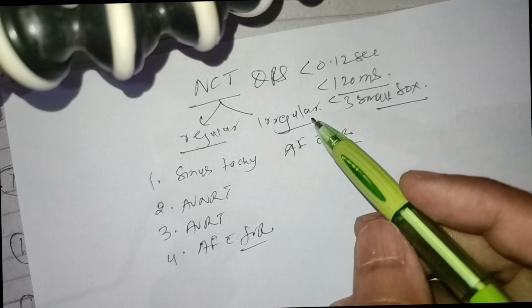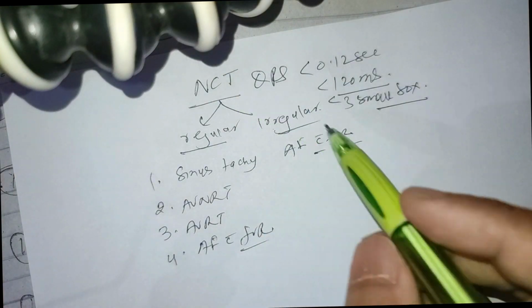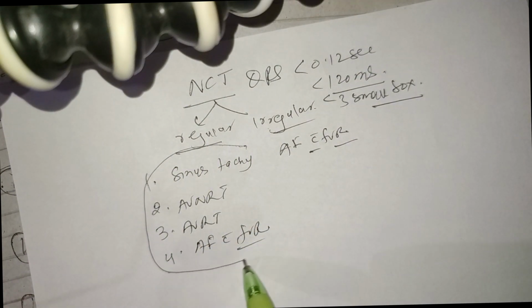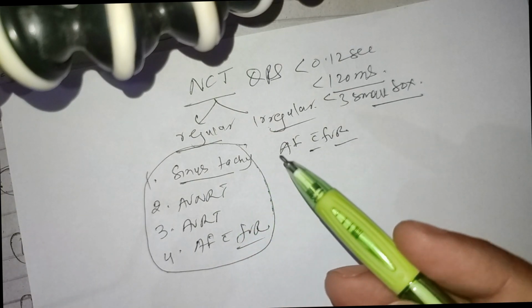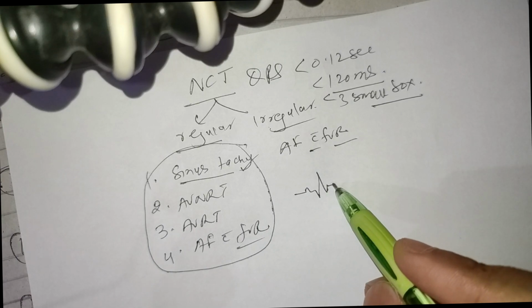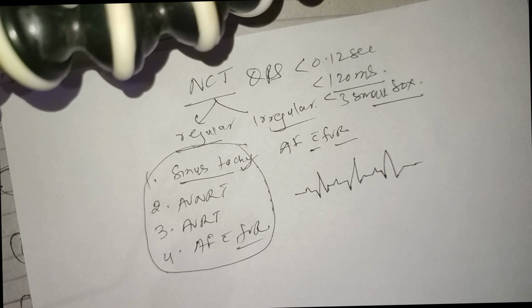So definitely if you see tachycardia and you don't see P waves and it is irregular, then you don't have difficulty differentiating whether this is atrial fibrillation or not, right? But here you can get confused in differentiating these 4 types of arrhythmia, because you will tell that, oh, I can differentiate sinus tachycardia because there should be P wave before each QRS, but it is not always.